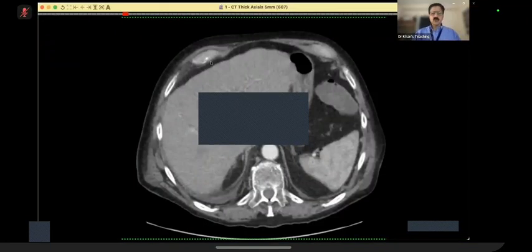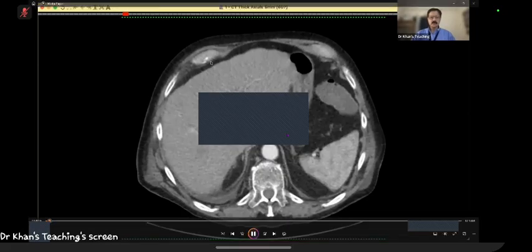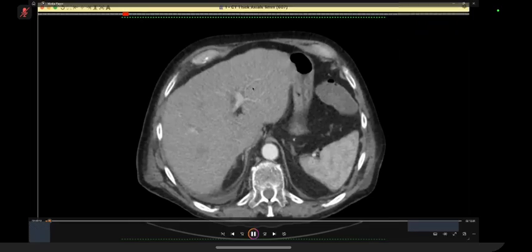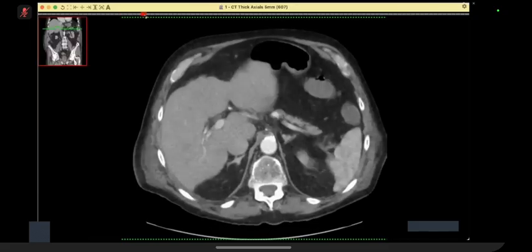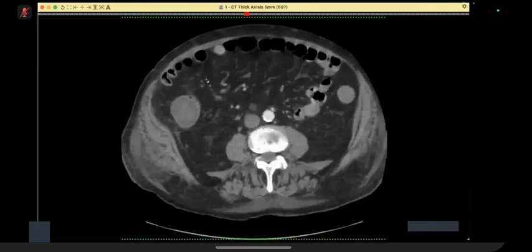From A&E. So we did a scan, you have got a sequence, and you can ask for the mouse, scroll through it. Okay, I have requested control. Yes. This is a contrast enhanced CT scan in the arterial phase. I'm trying to scroll. Okay. I'm going from up to down.